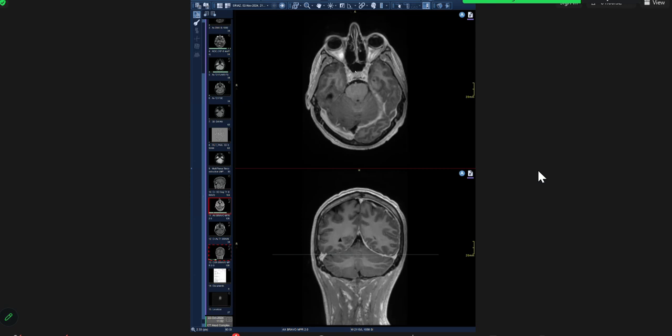Or there can be intracranial hypotension, but this is only involving the left cerebral hemisphere, so it is something confined. It is not a diffuse process. I cannot see any mass lesion or any other signs of infection in these images.